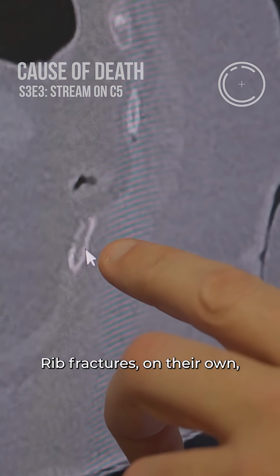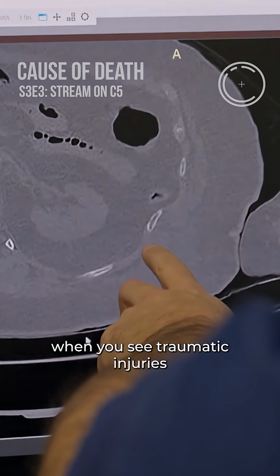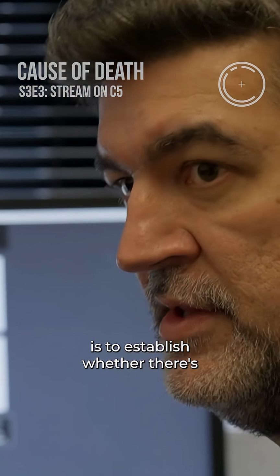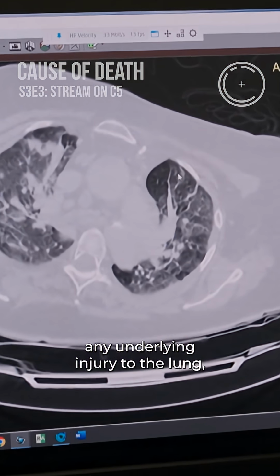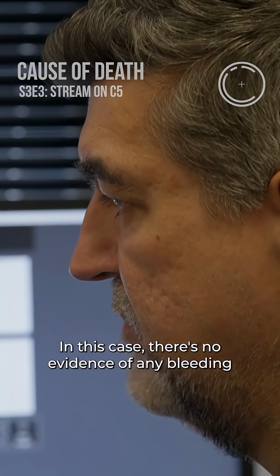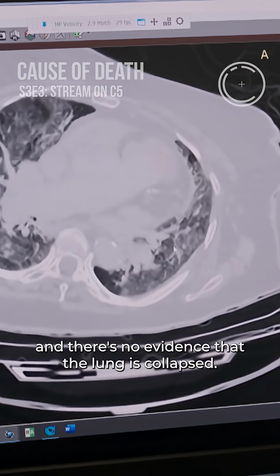Rib fractures on their own are unlikely to have caused someone to die, but what is important when you see traumatic injuries to the thoracic cage and the ribs is to establish whether there's any underlying injury to the lung, which can be fatal. In this case, there's no evidence of any bleeding around the lung, and there's no evidence that the lung has collapsed.